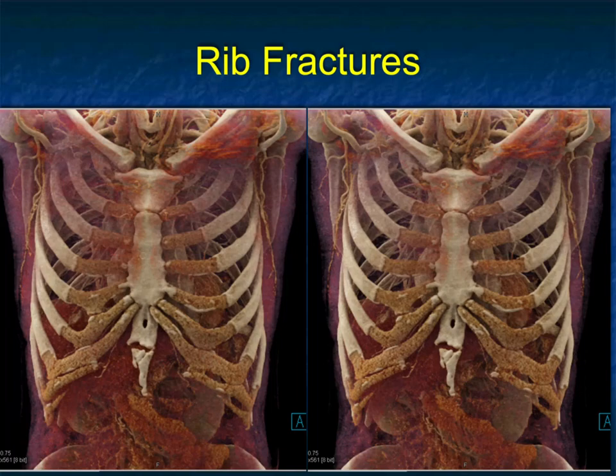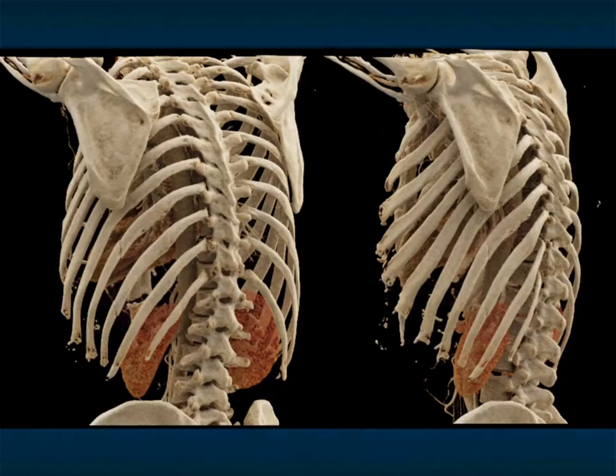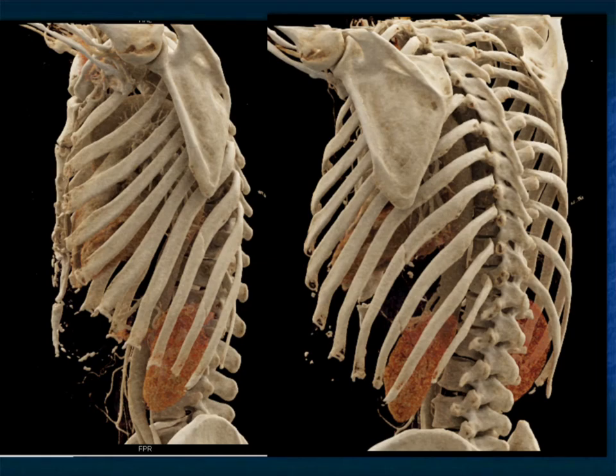I will be giving a talk on upper extremity trauma using cinematic rendering, so I'm not going to really speak about it except show you here how nicely cinematic rendering looks at the bone, looks at the rib, even non-displaced fractures. The ability to use cinematic with accentuation of bone and vessels and soft tissues is really very, very nice and a really good example of where things are going these days.